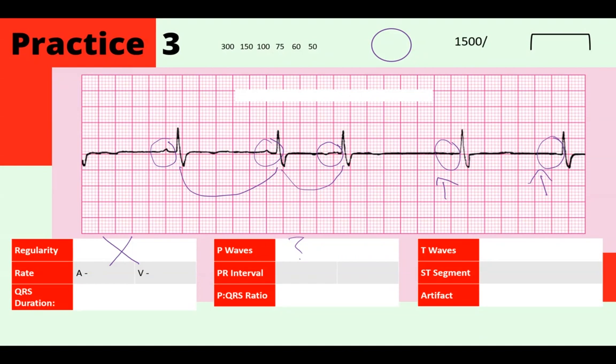2, and then a lack of P waves. This would be potentially 3 varieties of P waves. Do I have T waves? No, I don't. Remember, T waves don't change your interpretation. It's just something to keep note of for now. You'll get more into that with your 12 lead class.